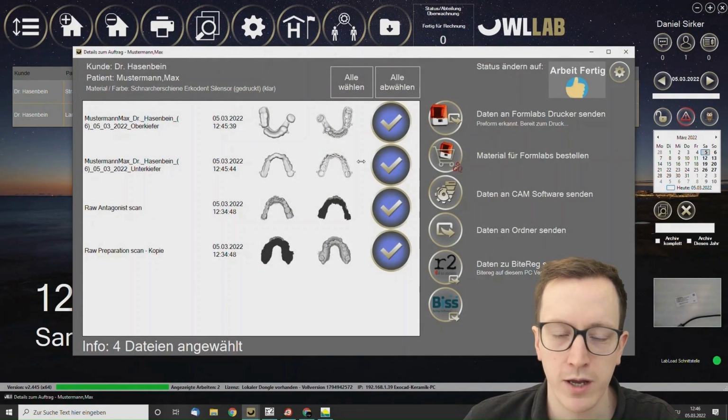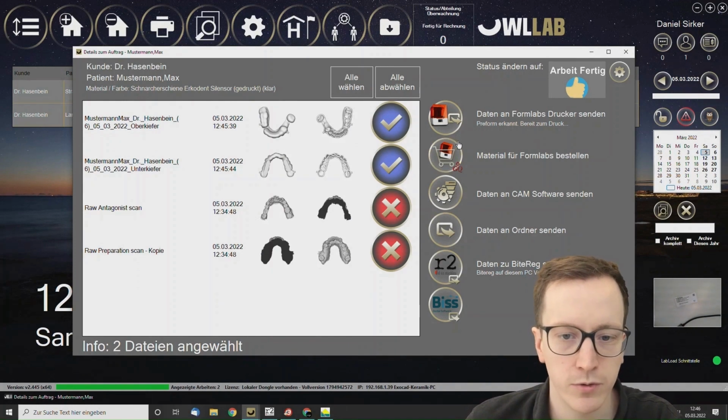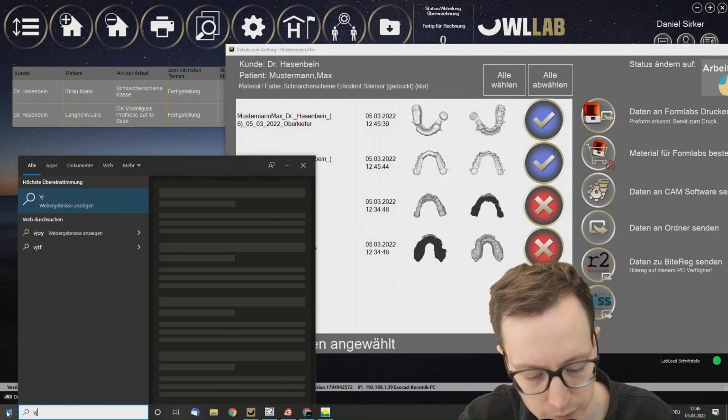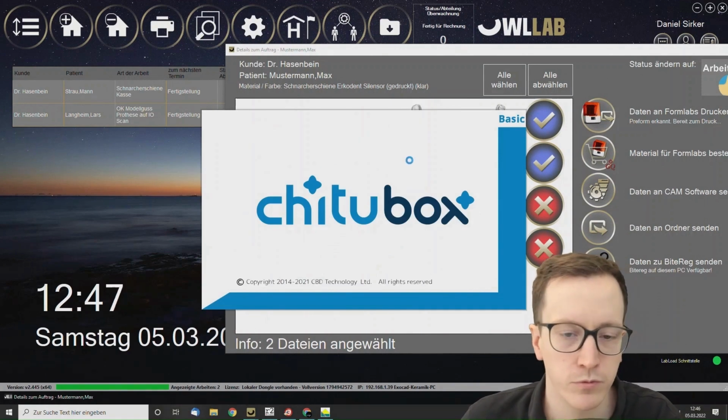Therefore, at this moment, I am able to proceed to a printer system through the subsequent interface that is located nearby and accessible for my use. I would merely transmit the two finalized CAD splint data as an illustration to a printer interface in order to complete the process. However, this can also be accomplished using alternative software solutions.